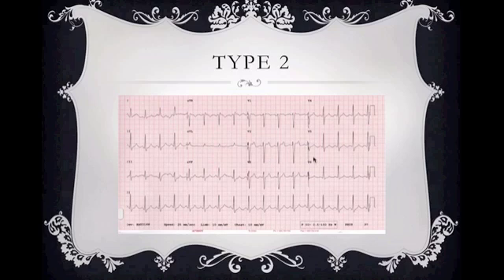Keep that in mind. Here's a type 2 sign. Very hard to pick out in the field. We're not going to really distinguish between Brugada's or a type of ST segment elevation. What we would find kind of weird is if you're looking at this and you're going, hey, does my patient have ST segment elevation in V2 but they don't have it in V1? I can't call it a septal wall MI because it's not two contiguous leads. Well, why is it not contiguous leads? It's probably Brugada sign due to the saddleback type ST segment elevation.